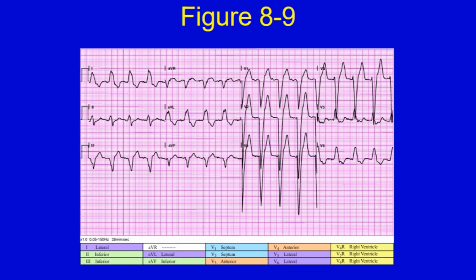What else does it have to be a bundle branch block? No, it doesn't have to have rabbit ears. It might have rabbit ears, but it doesn't have to. It's got to be in the leads. It has to be a sinus rhythm, a rhythm above the AV node.